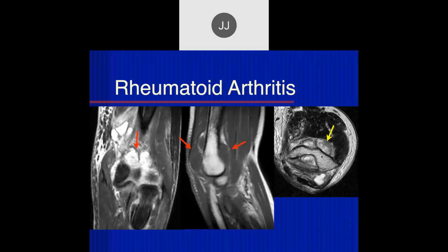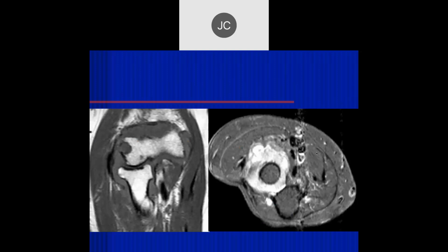The thickening and the fluid is way up above. That's what gets me. It should be around the joint. Up here, you mean? And more down than up. Yeah, because that's arm. Well, you'd need to do a little biopsy or some test.